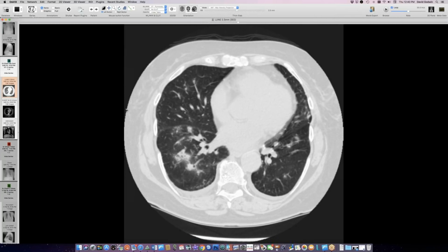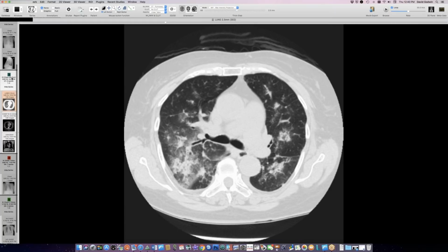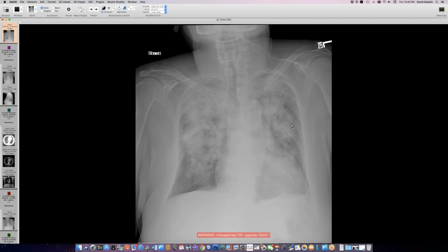It looks most like infection. She's got pleural effusions accompanying this, and her radiograph got worse over a couple of days. Here's a few days later, you can see that this consolidation has not slowed down, and 2 days later, it's even denser. So she was bronched, and she had increasing return of blood on lavage, so they diagnosed pulmonary hemorrhage, and the cells were submitted for cytologic analysis, and she had 30% eosinophils. By this time, she had a 6% blood eosinophilia as well.